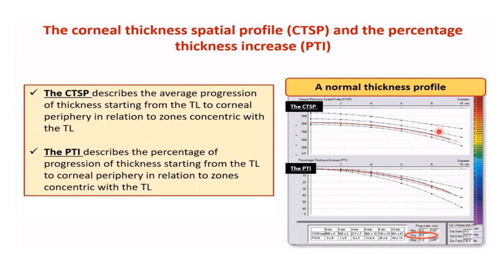This is the presentation of the raw data with two confidence intervals, 5 and 95%, and the middle line represents the average, and the red line is the raw data of the patient. As long as the raw data of the patient falls within these two confidence intervals, this indicates the progression is normal. However, any deviation from these two tram-like lines indicates that there is abnormality.